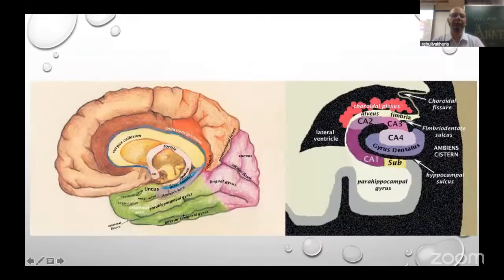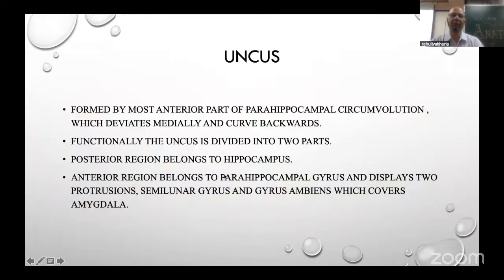You can see this. This is the green, the parahippocampal gyrus. This is the lateral aspect, divided into two parts. The superior part, which continues with its isthmus, goes above and connects with the cingulate gyrus. This cingulate gyrus will loop around the corpus callosum, come into the subcallosal septal area and end here. This area is called the septal area, and then the inferior portion will continue as the lingual gyrus of the occipital lobe.